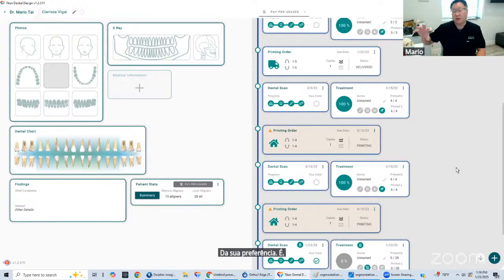Then once you put that on the tooth surface, with the force factors, the feature that we have that understands where the forces need to be applied, it'll position that preferred attachment where it needs to be. With that, it'll help you have the most effective forces to achieve the movements that you've performed.